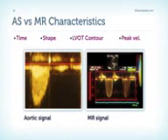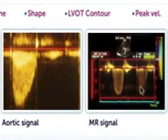Timing is different, for example. Mitral regurgitation is longer in duration, starting with the mitral valve closure and ending with the mitral valve opening. And looking at the signal of the aortic stenosis compared to MR, the aortic stenosis has a more dagger-shaped signal, whereas the mitral regurgitation is rounder in shape. Look here.